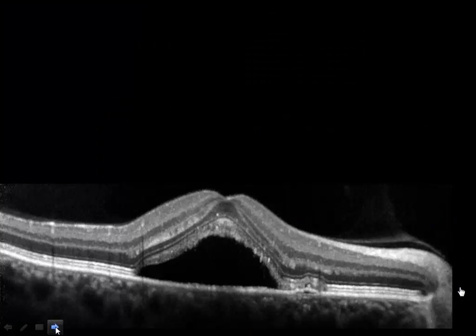Well, here's an OCT. What are we getting here? Well, here's the retinal pigment epithelium. Okay? So all the rest of this is the neurosensory retina. So we're getting a clear fluid with serous detachment of the neurosensory retina. We're also getting something going on over here. It looks like there's a little PED. Here's the retinal pigment epithelium. So that's detached a little bit or elevated. So pigment epithelial detachment and a much larger neurosensory retinal detachment.